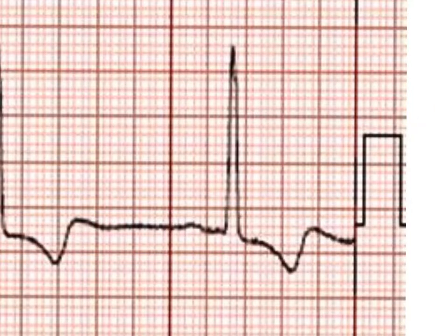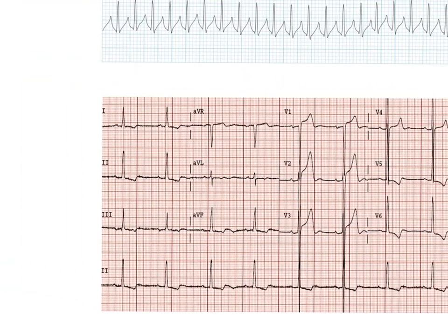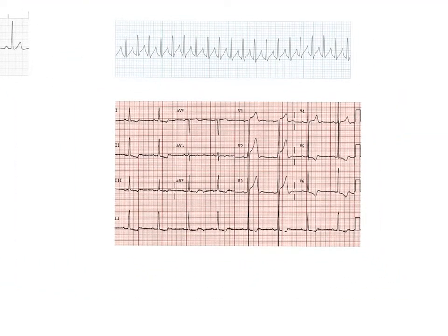Okay, so this is standard calibration. This is 10 millimeters per millivolt. Ten small boxes in height is the standard gain setting. I'm going to move back out here. So that's what you look for.